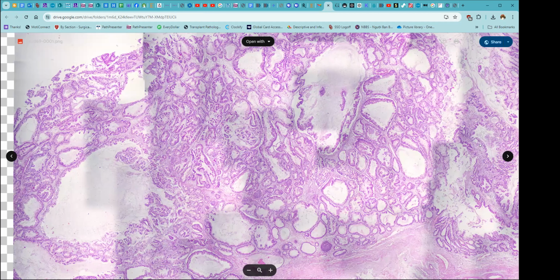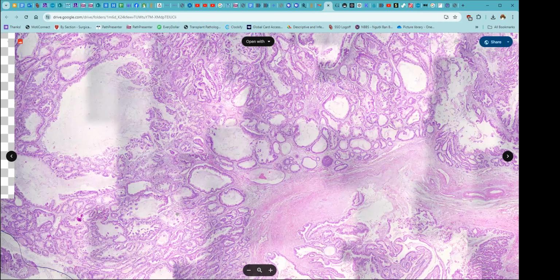Now, you had sent us some immunohistochemical stains as well, but if I were to say one thing that this looks like, it would be of some of the low-grade mucinous neoplasms that we see in the GI tract and in the ovary. This was a woman, and interestingly, there have been reports of retroperitoneal and perinephric masses that very much resemble mucinous cystadenomas and mucinous neoplasms of the ovary. So I think this made that thought come to mind.